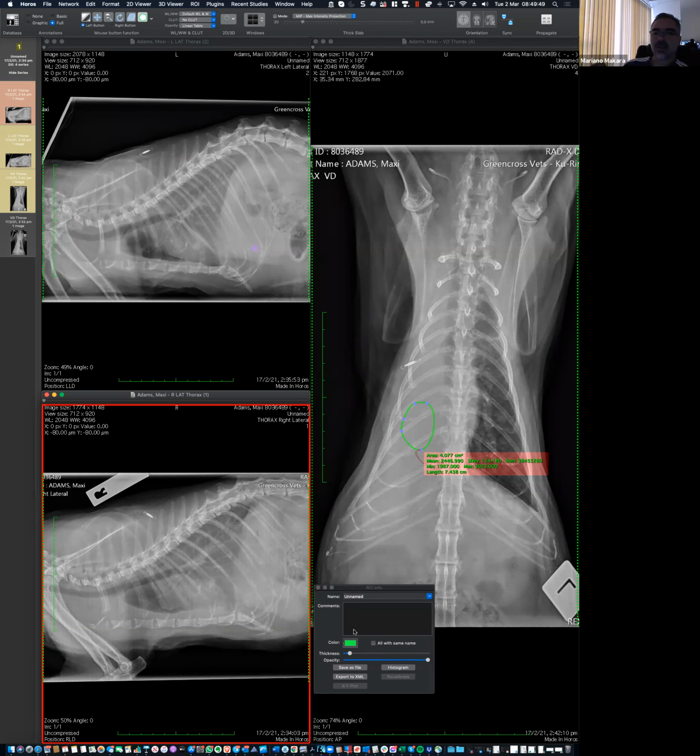Where I'm not guessing is in saying, if we assume that there is a mass in the airway, I clearly know why we don't see it. And the reason is how I showed you in the CT. That mass is going to be surrounded by fluid, and that is going to happen regardless of the recumbency. That's why I don't have the expectation to see it in any projection. And we're only looking at the left lung, both laterals. Yes, correct.